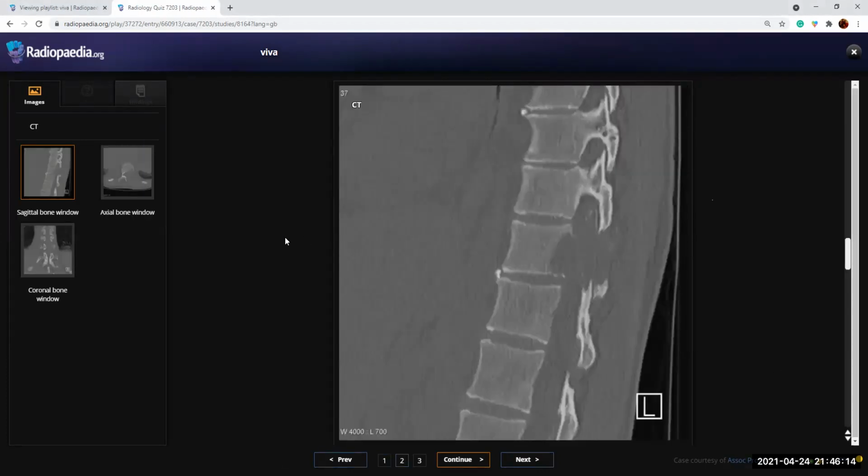Okay. So what I can clearly see is that there is destruction of the posterior aspect of the vertebral body, perhaps D11, along with the destruction of the posterior elements as well. The disc spaces are well preserved. Considering the maintenance of the disc spaces and the involvement of the posterior elements by the destruction, I would keep the metastatic lesions as a prime possibility in this patient, and would advise the clinician to do a contrast enhanced pan CT body to find the primary in this patient.